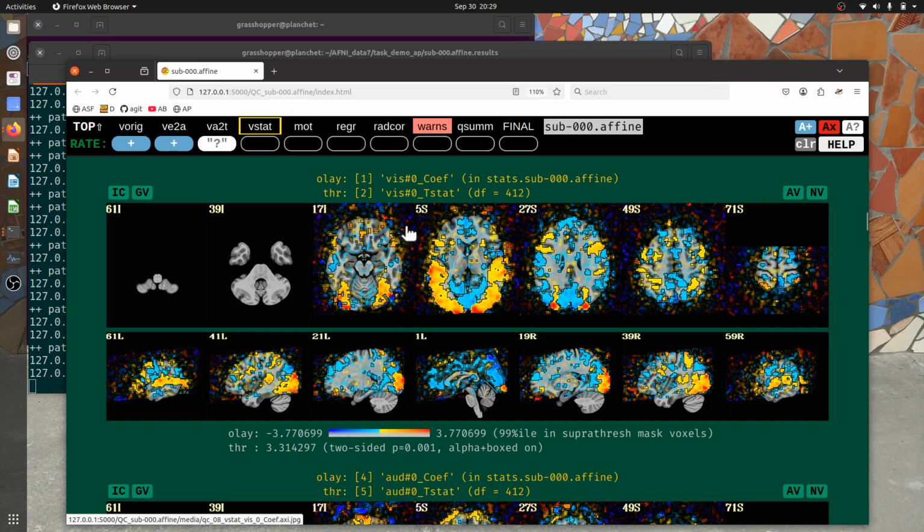You can even see here that the values out here, the colors, are dark red and dark blue. That just gives a sense of how much even noise can correlate with a stimulus design. It has relatively low uncertainty in things, and by the time we do group level statistics, that goes away more. So this is pretty reasonable.